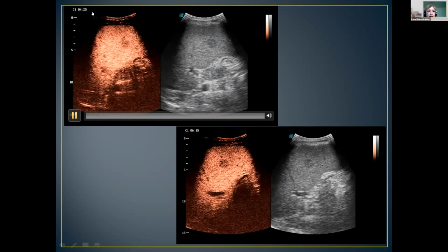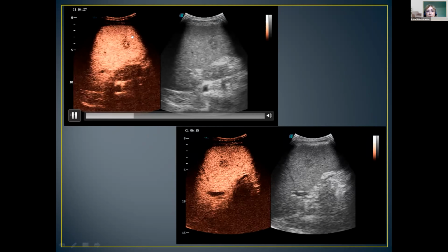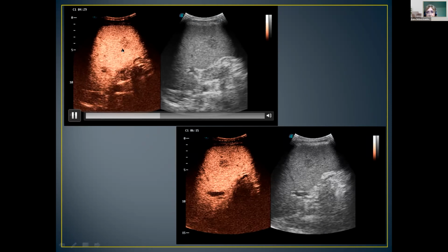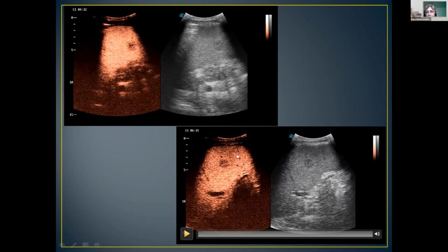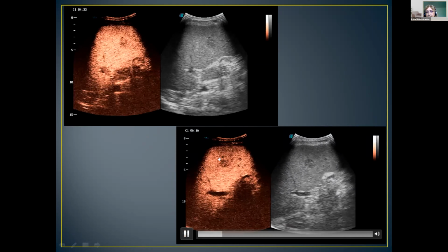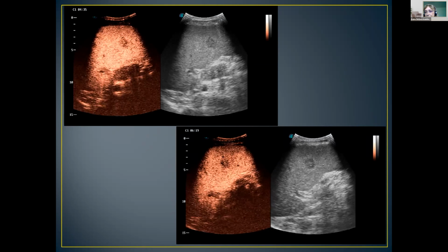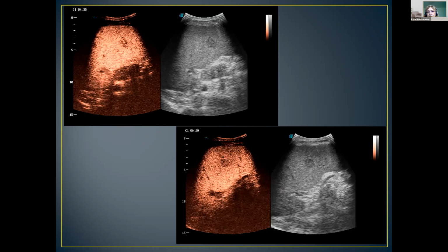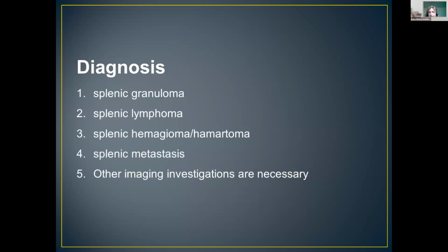At 4 minutes after injection, slow washout. And at 6 minutes after injection, the same slow washout. What is your diagnosis?